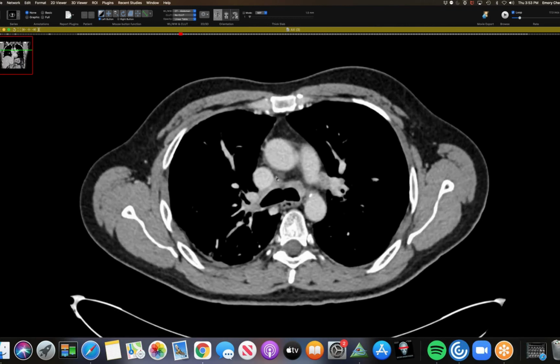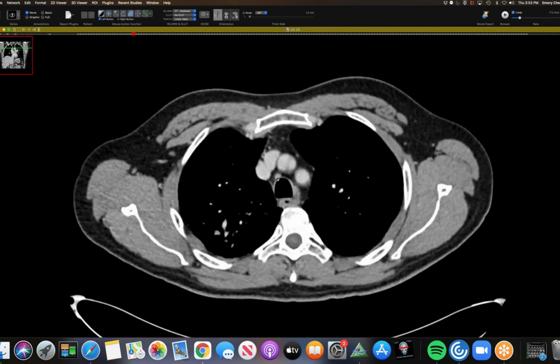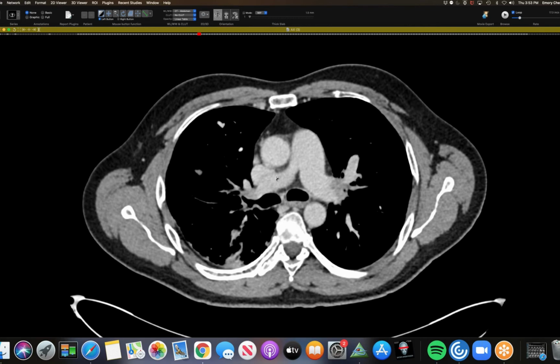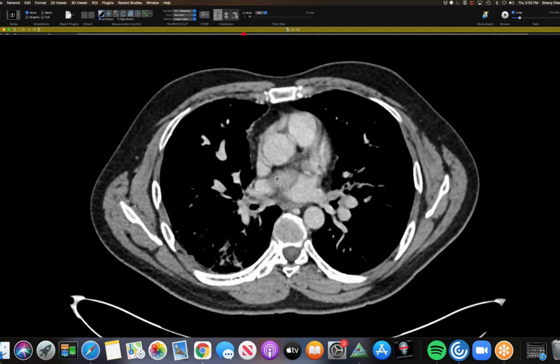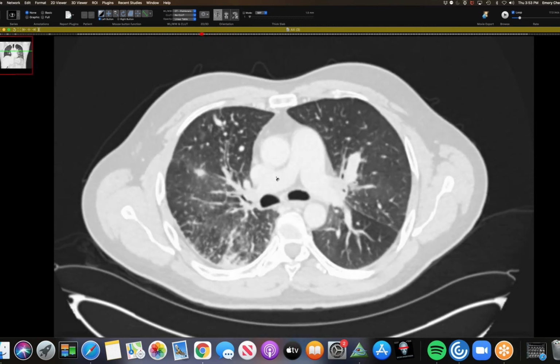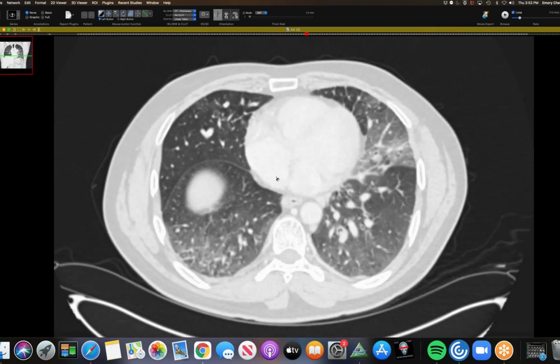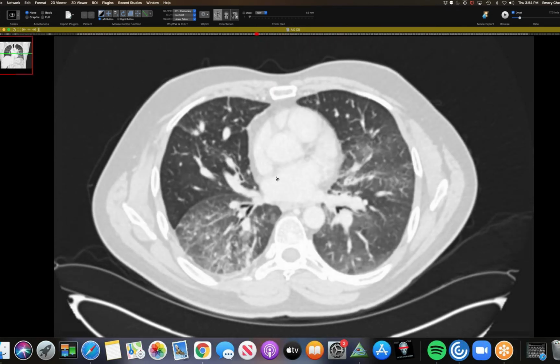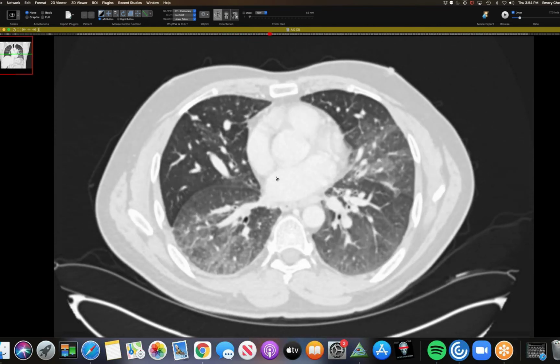and it's usually unilateral. This is a bilateral process too, which I don't know. I don't buy silicosis causing the vascular stuff. I don't know what David and Howard think, but yeah, I agree. This is in a sense a florid sclerosing mediastinitis picture, where it's taken out structures and enclosed them in collagen rather than the usual complicated silica in the lungs. This is quite different from that too.